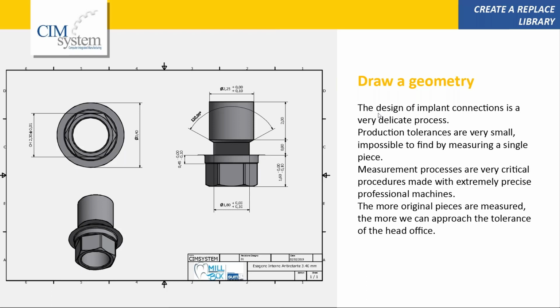You have to know the design, possibly a bidimensional design like this. You have to know the tolerances of the design of the pieces. You have to be able to take these measurements, and so it's very important to understand how they are made and how to measure them.